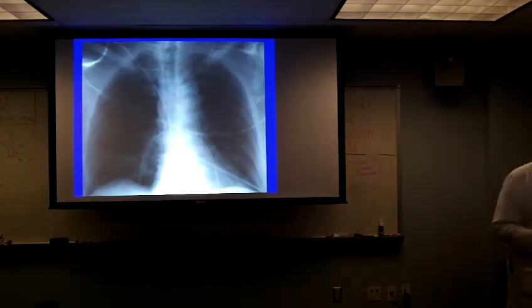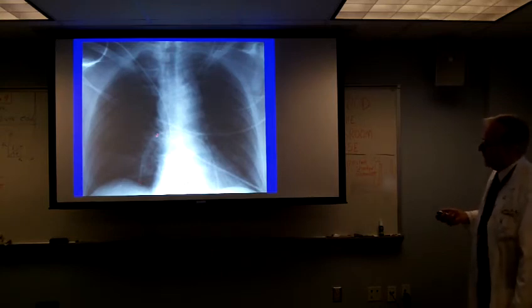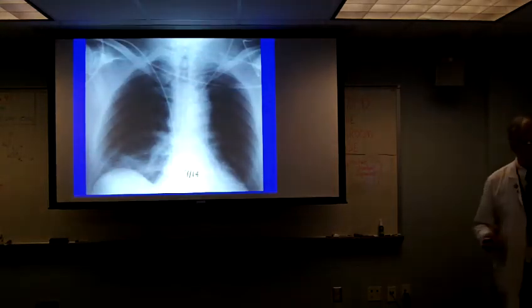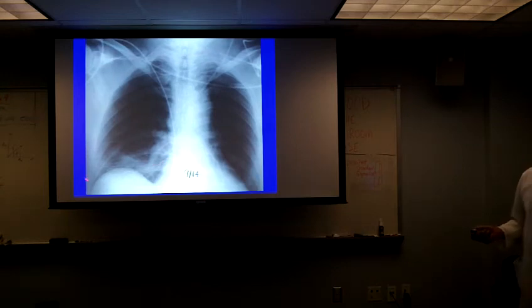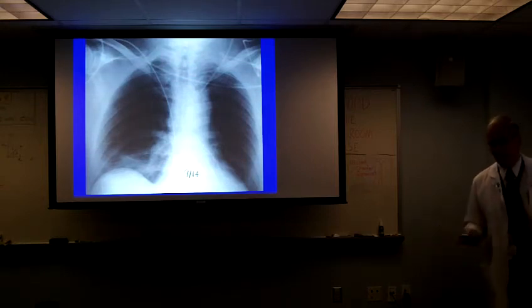And this is another patient with a malpositioned Swan-Ganz catheter, transferred to us from an outside institution. Look where that tip is. And this is what that looked like the next morning, and this is pulmonary infarction. They didn't blow up the balloon, but they occluded that pulmonary artery. And it's the same thing physiologically as having a pulmonary embolus.